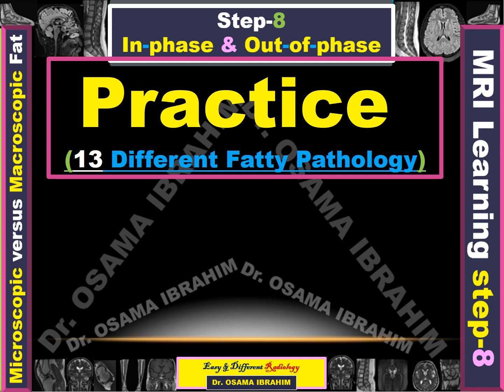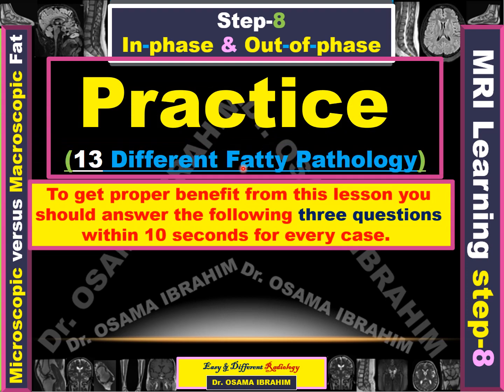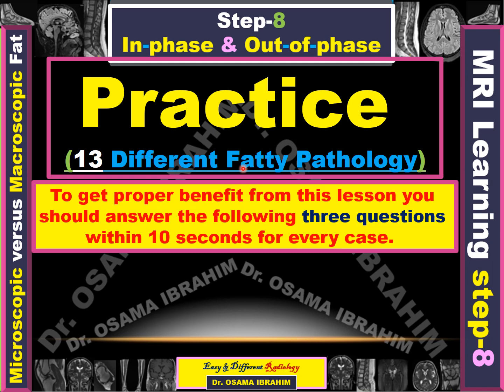Now we should practice, because practice helps to confirm the lectures and the presentations. I have 13 different fatty pathologies for practice, and to get proper benefit from these lessons, you should answer the following 3 questions within 10 seconds for every case. I think learning this way will also help you make fewer mistakes with MRI film reading.